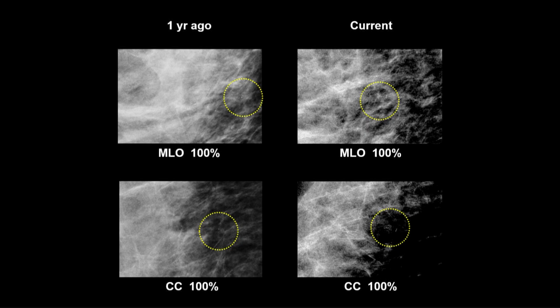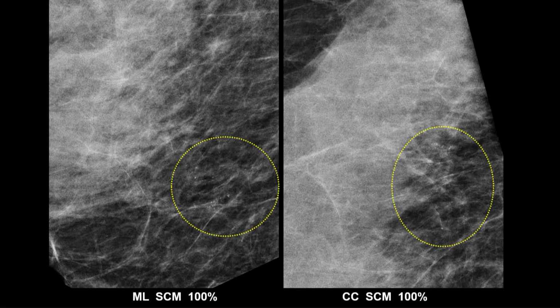And it did, fortunately. And the first thing we're going to do on this is we're going to do spot mags. We are not going to do ultrasound first on this. The spot mags, if they showed some typically benign thing like layering calcifications, that might stop the workup. And we wouldn't need the ultrasound, unless you wanted to do screening ultrasound because she's dense.